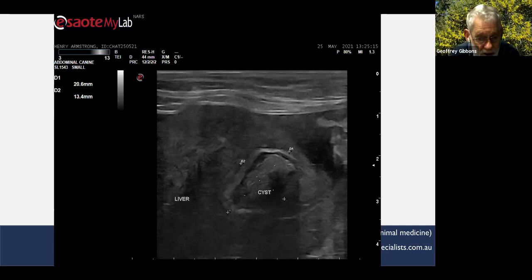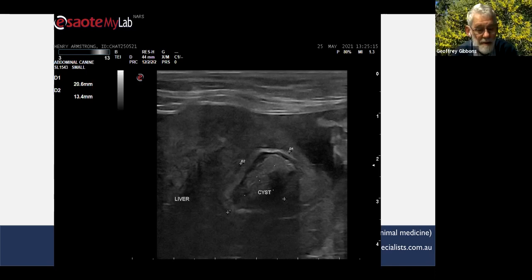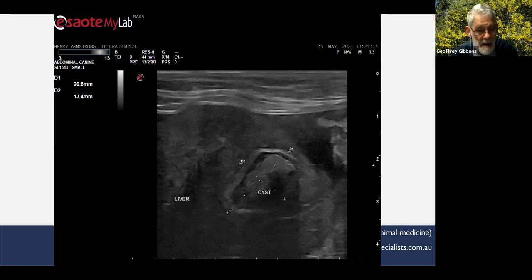Well, mixed echogenicity and texture. And it's hard to say whether that's the gallbladder or not. Also, there's fluid there on the upper right of the image. Good. And just to the right of the fluid, I'm not sure what that is. If that's liver, it's not very happy. No, that's fat. Yeah, that makes more sense.